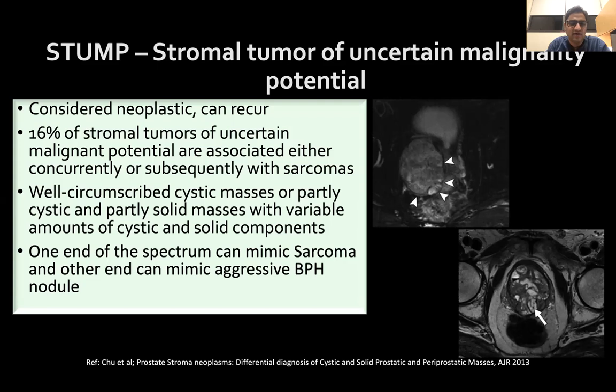And so at one end of the spectrum, they look solid and can mimic sarcomas, and at the other end of the spectrum, they can look cystic and mimic aggressive BPH nodules. And when in question, always go ahead and biopsy these as well.